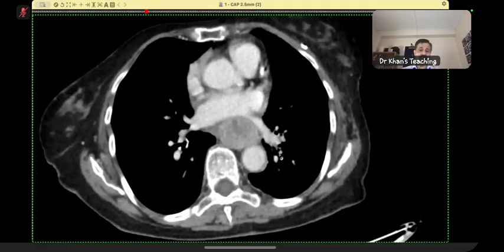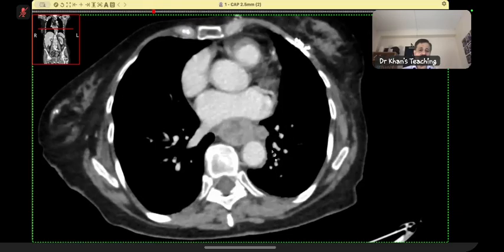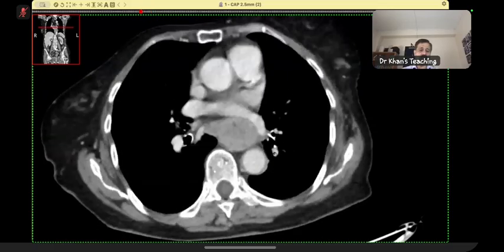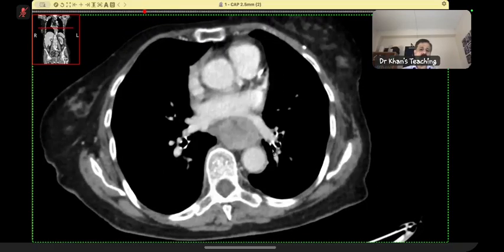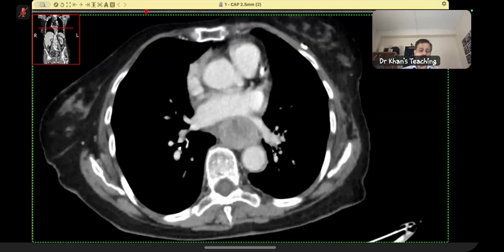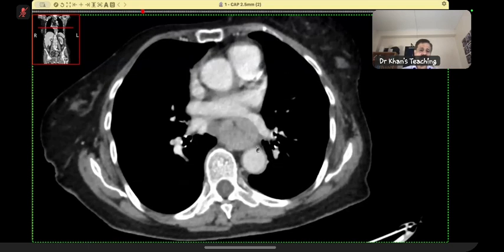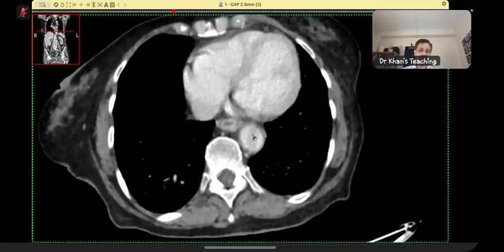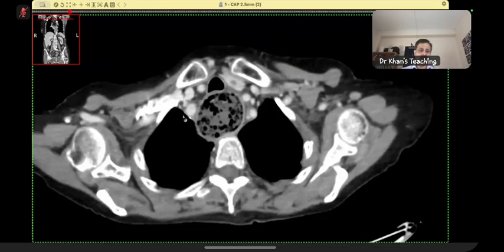More than 90 is a definite invasion or encasement. Between 45 and 90, doubtful. So the best way to deal with it is that you again advise an endoscopic ultrasound. And please remember, in this particular case it might be irrelevant, but endoscopic ultrasound will tell you. So the fine touch is that it is in the gray area zone in this case. So these are two fine points. Otherwise, you did very well.